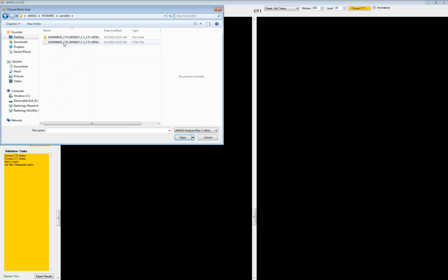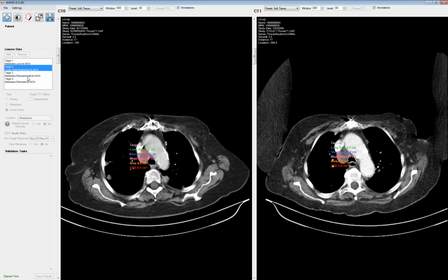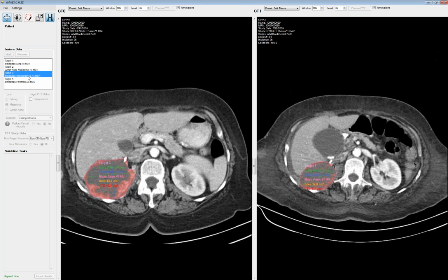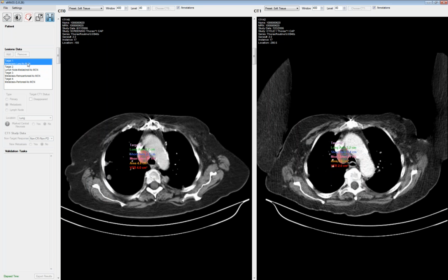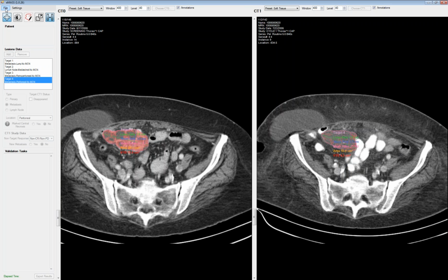All right. It's very possible to go back in and reload cases. And when you do that, you can fairly quickly double-click and go straight to the lesion. So for a moment, just imagine that this is longitudinal. Maybe this is a new scan and this is the old scan. It'd be very easy to find that old target lesion. You know, in real radiology practice, you have to manually scroll through to find things like that. You don't have to do that here. You're already going to easily get to these target lesions just by double-clicking on them, and then it makes it very easy to measure your new target lesions.